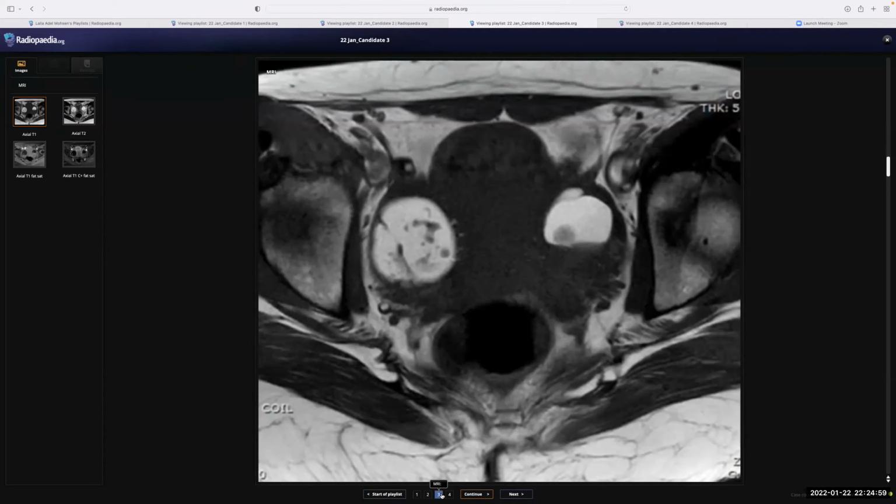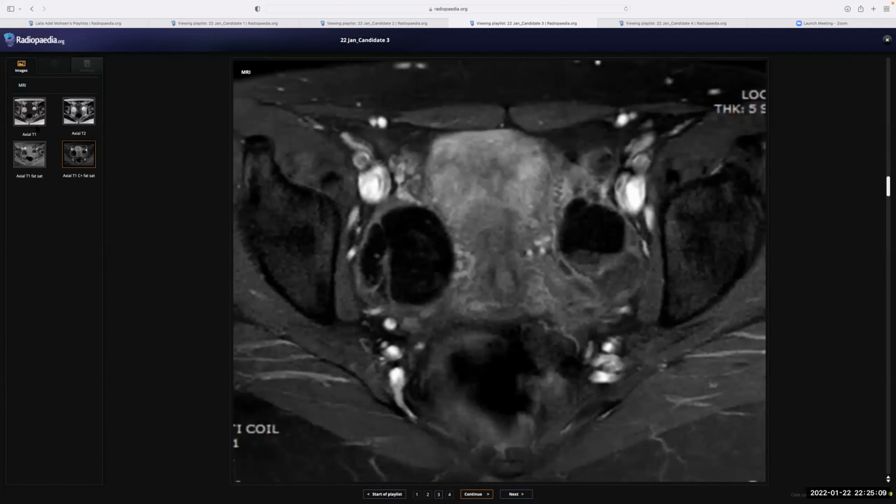Okay. Sure, yes, they're available. Okay. Well, I'm trying to. Okay. Well, it is fully suppressed on fat suppressed. So these are fatty lesions, and this conveys the impression of fatty lesions like dermoid, bilateral dermoid, or teratoma, mature teratoma.